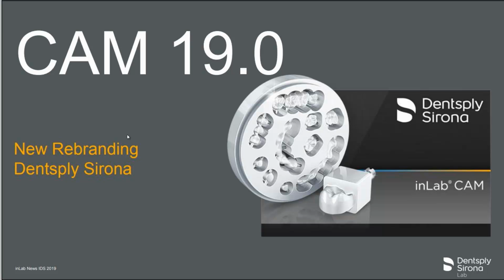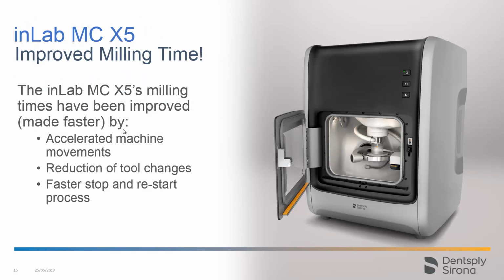For the inLab CAM 19.0 software, we also have the new rebranding Dentsply Sirona. What's really cool is we have improved milling times with the inLab MCX5. It's a lot faster thanks to accelerated machine movements, reduction of the amount of tool changes that it has to do, and a faster stop and restart process. I've noticed my milling times have been a lot faster, and you can actually see the machine moving a lot faster in there.